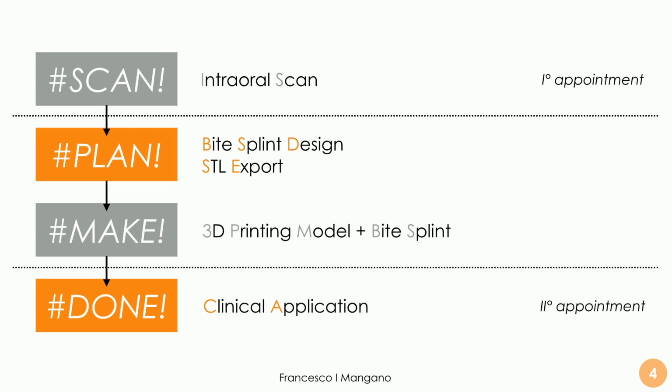The planning is made entirely in computer-assisted design software, and I have to say that we have also this option today during the first appointment, not only scanning the patient with an intraoral scan, but also using a digital condylography, a machine like Mojo, very powerful, to gather data of the movement of the mandible in space, individual movements of that patient, in order to replicate this movement in the virtual articulator, with the export of this movement exactly inside the computer-assisted design software. And with Mojo, it's possible. I will show you something later.